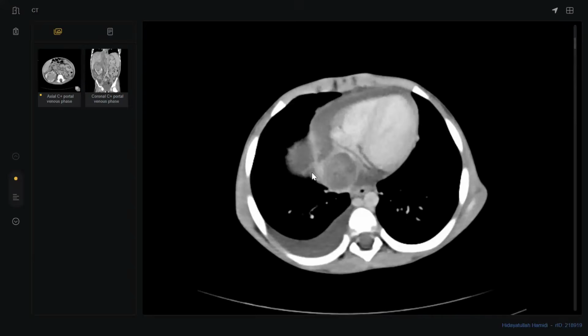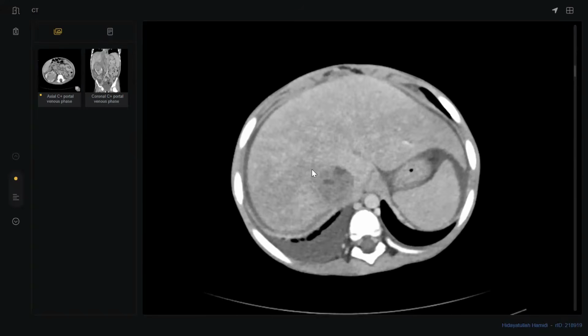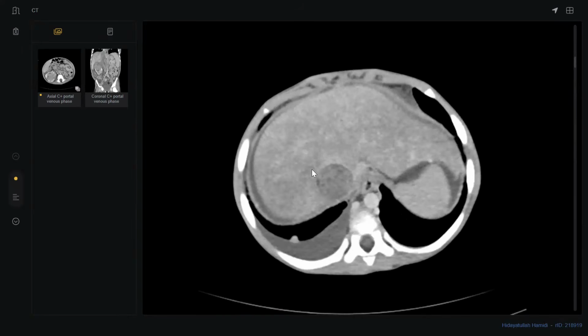Do you think this patient is operable or inoperable? This patient is not preferable for surgery. Why not operable? A tumor thrombus is extending into the IVC. Are you sure this is tumor thrombus? It may be plain thrombus. The differentiation between tumor thrombus and bland thrombus is important.